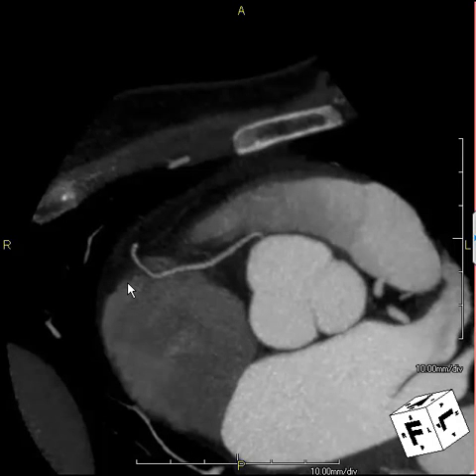In summary then, we have a 46-year-old woman who has had what now appears to be accelerating angina and has evidence of left main focal obstructive disease with possible dissection or ulceration in that region. She only has mild plaque noted in the mid portion of the left anterior descending. She also has sort of mixed complex disease in her thoracic aorta, but she retains normal left ventricular size, shape, and systolic function.